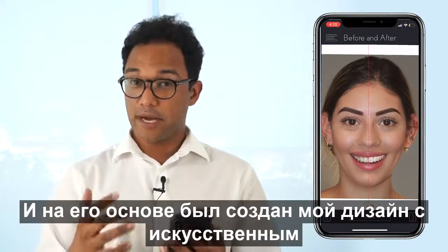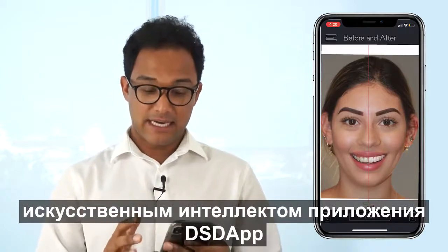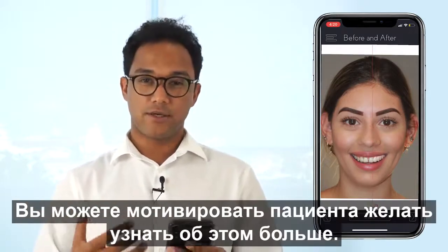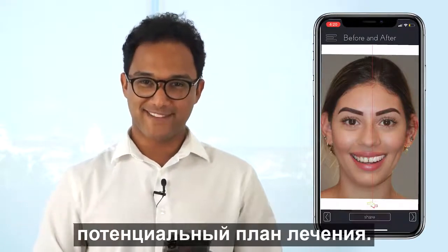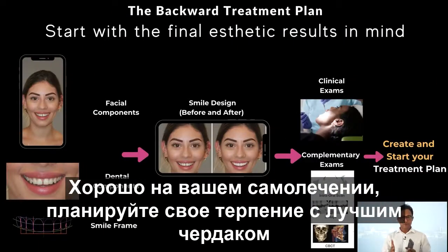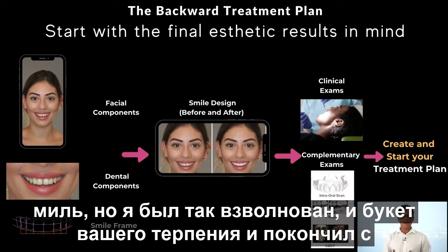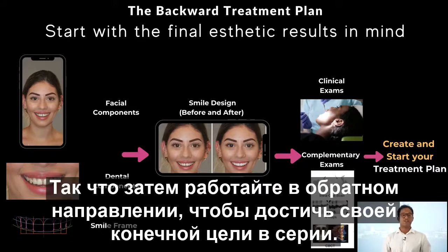And based on the smile design that was created with the artificial intelligence of DSD app, you can initiate your conversation with your patient. You can motivate your patient in wanting to know more about this potential treatment plan. When allowing yourself to treatment plan your patients with the final aesthetic result in mind, you not only deliver more assertive, natural, harmonic smiles, but also excite and educate your patients and dental technicians on what you are envisioning for your patient's treatment plan to then work it backward to achieve your final goal.